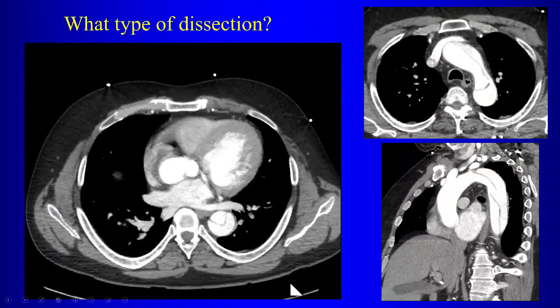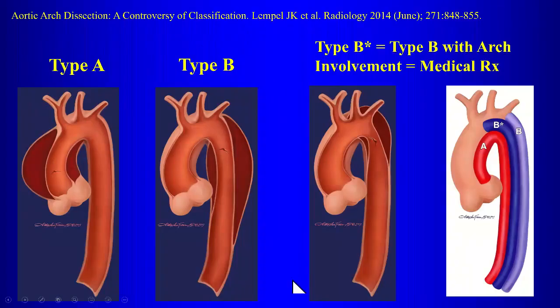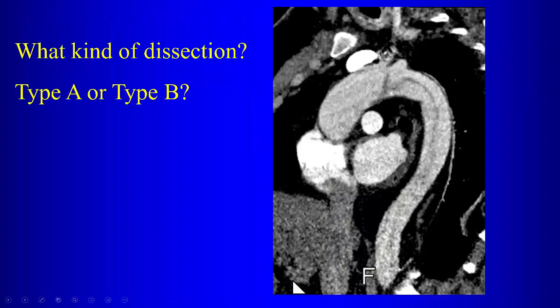Just to ask you. This one or this one? Yeah. Okay. Yes, that's a vessel, yeah. That's probably the left subclavian. No, this is not a tear here.